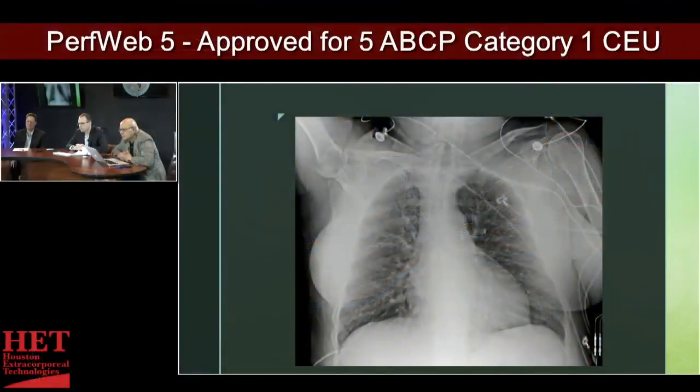And so when we get to the ICU, you know how this works. Everybody crams in the elevator, takes the ride up to the ICU, and then everybody gets everything plugged in, and we're chomping at the bit to start cleaning the room and get our next case going. But we sit and we wait and wait for X-ray to come, and they shoot the X-ray, and then we look at it. And this is one of the things that we're specifically looking at. What is the position of the balloon pump?